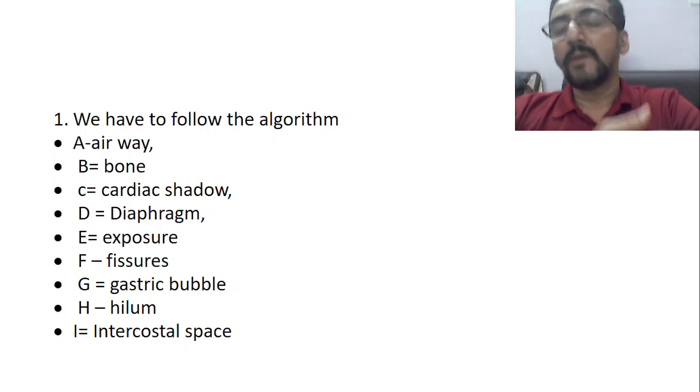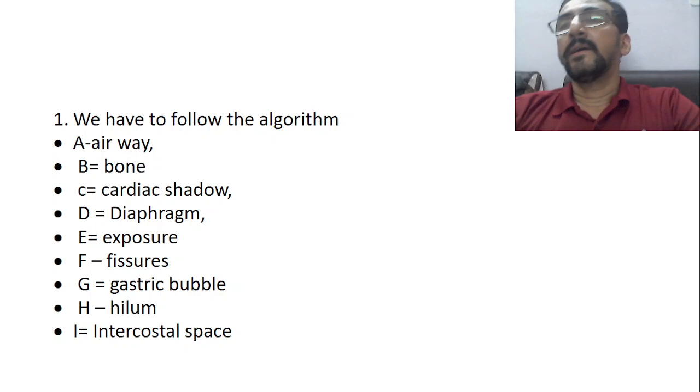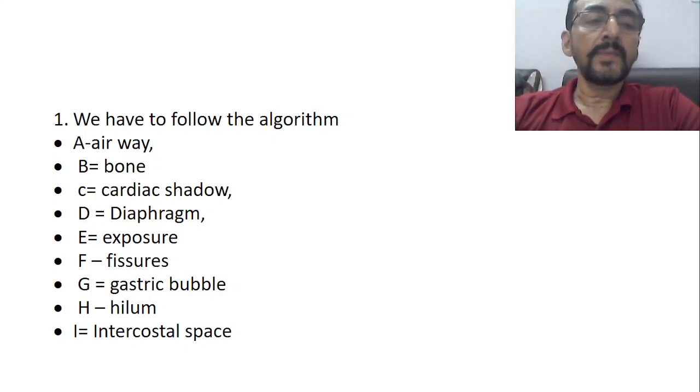That we will see in the next class. But what is important is exposure, whether it's completely exposed. If the exposure is not proper, then you cannot look into the X-rays. Then fissures we have seen.